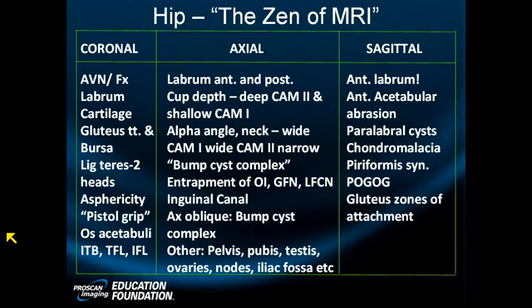What about the labrum? Well, this time we have plenty of supplementary signs that would push us more towards a tear than a sulcus. But okay, remember our sulcus? Remember what it did? It didn't go very deep, did it? We make this the labrum.